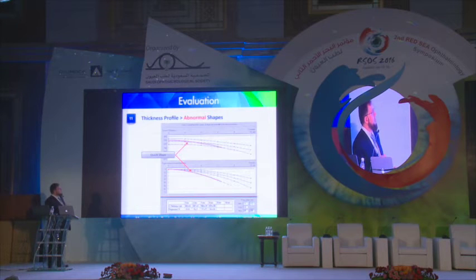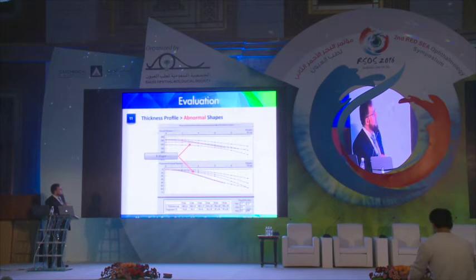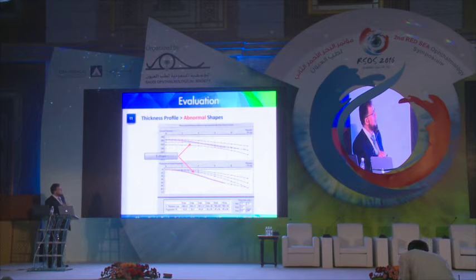Look at these shapes. There is a quick slope. It leaves its passage before the 6 millimeter. This is S shape. It comes down, then up, which is seen in ectatic corneal disorders.